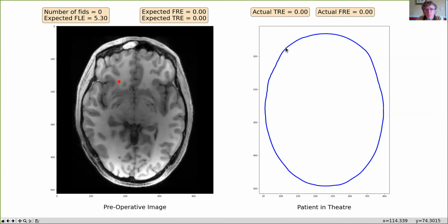intraoperative. So we'll place one marker, we'll stick one up here. F.R.E.D's quite permissive about where you can place markers. Obviously, in practice, you generally can only stick them to the outside of the patient's skull. This software will let you stick them anywhere. We'll try and stay physically plausible. We'll stick one up here. And if we have a close look at what we've just done, this is the important point.